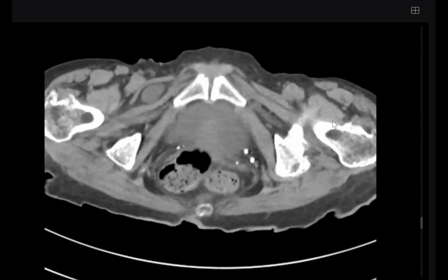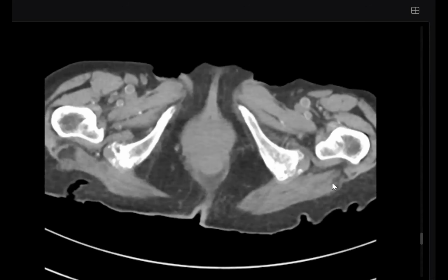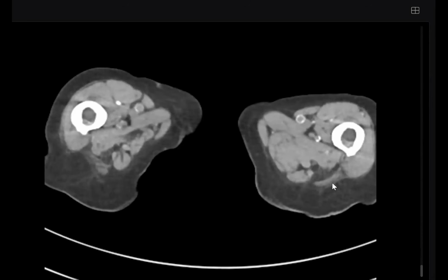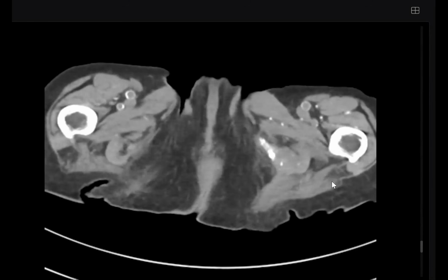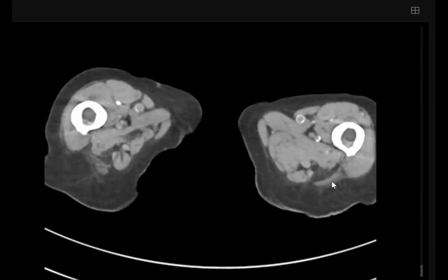Okay. Sir, it's not scrolling. It's very fast with my mouse. I'm trying to scroll through the mouse, but I still... I will take it. I will scroll. Okay, just give me the mouse. No problem.